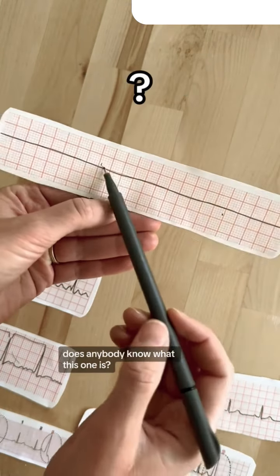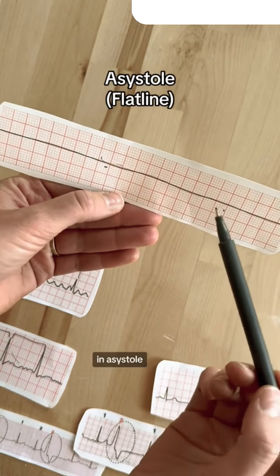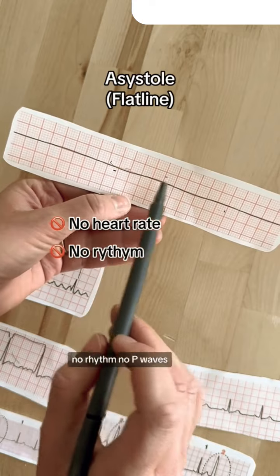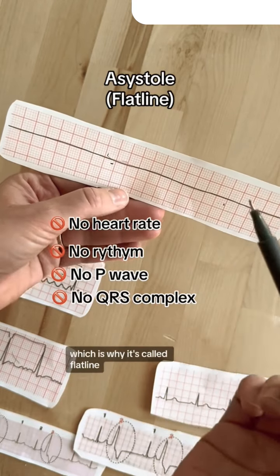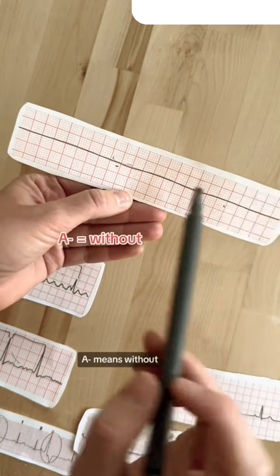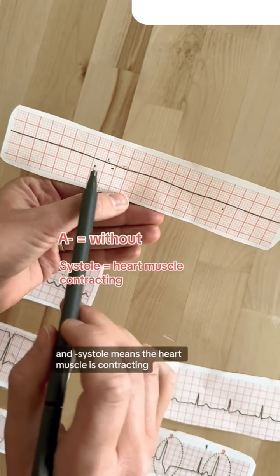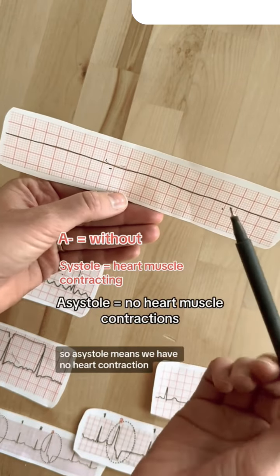Okay, this is our next one. Does anybody know what this one is? This one is asystole or flatline. In asystole, we have no heart rate, no rhythm, no P waves, and no QRS complex, which is why it's called flatline. If you remember your medical terminology, A means without, and systole means the heart muscle is contracting. So asystole means we have no heart contraction.